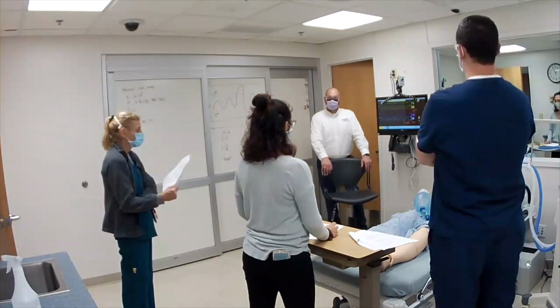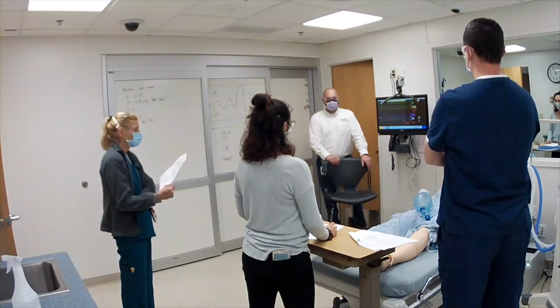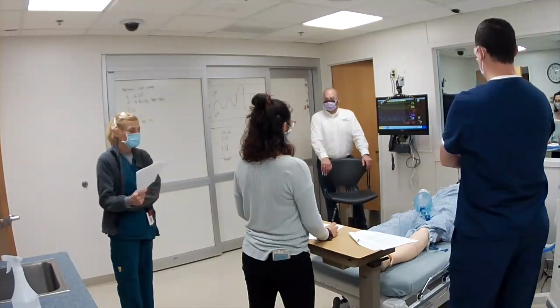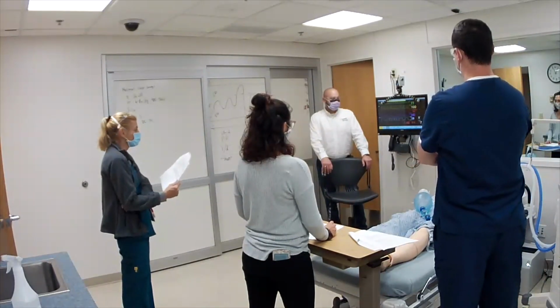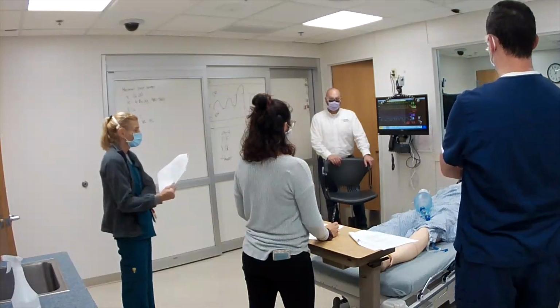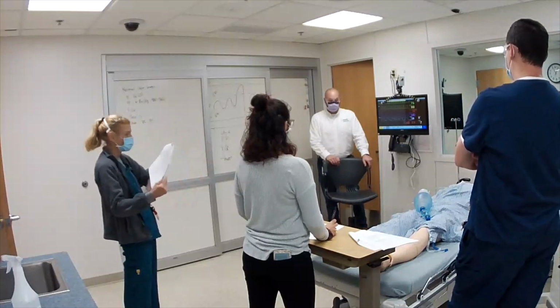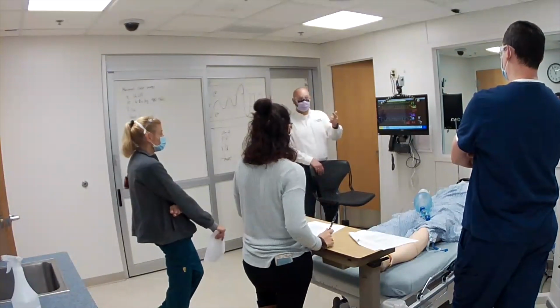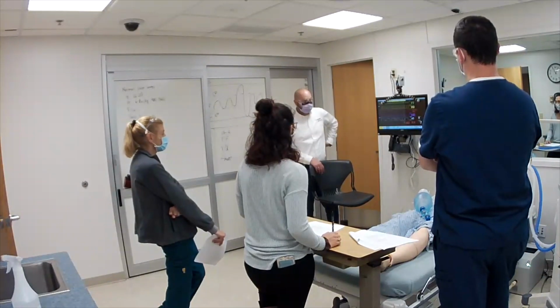Okay. So what do you think will happen? Do you think his oxygen will fall faster? Will he become hypoxic or hypercarbic first? Hypercarbic. And why? Because he's not breathing enough. Right. So that's predicted, right? He's going to become hypoxic and hypercarbic eventually. We're going to let this run for 10 minutes, and we'll see how bad Stanley gets. Do you think he'll survive that 10 minutes, or do you think he'll arrest with those settings? He's definitely going to get sick, though, right? I think we all can agree that Stanley's not going to do so well with this. So you think he's going to get hypercarbic first? Everybody agree? Okay. All right.